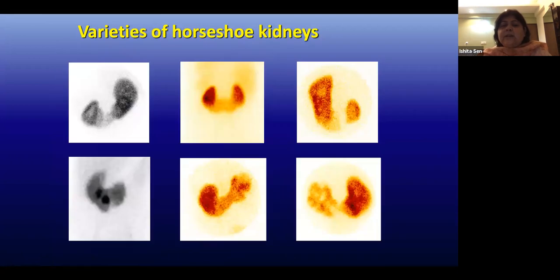All right. These are horseshoe kidneys. These are just put up for interest. You can see both the moieties, and you can see the functioning band which is joining these. So these are spotters which you may see during your vivas.